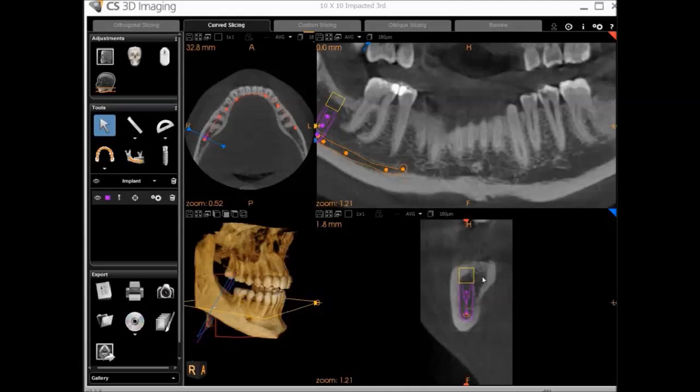The implant is placed in the transaxial slice and is displayed in the reconstructed image as well as the axial plane. If necessary, you can adjust the position of the implant. Move the implant in the axial slice, maintaining its orientation using the center dot. It may be necessary to hide the arch trace. To do this, select the eyeball icon for the arch in the Tools panel.